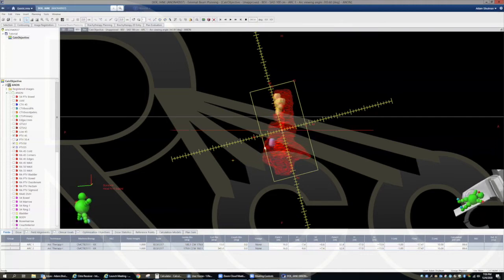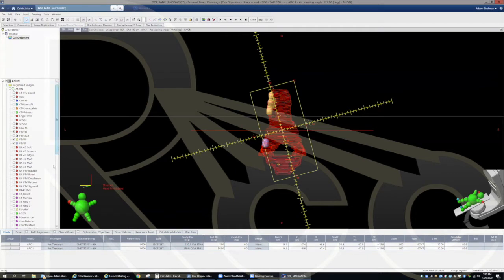So I don't necessarily need to cover everything in all the beams I've used, but here I'd like to cover this side the whole time in this beam, and I'll cover the other side the whole time in the next beam. So I've got slightly asymmetric jaws, reversed. And just in this case, a 15-degree collimator kick on both beams. I tried 20 at first, and I was missing a little, cutting off some tissue, so I moved it to 15. I wouldn't typically go lower than 15.